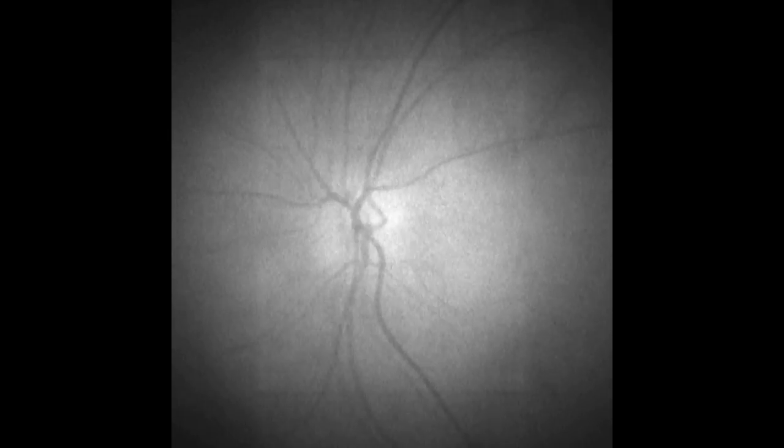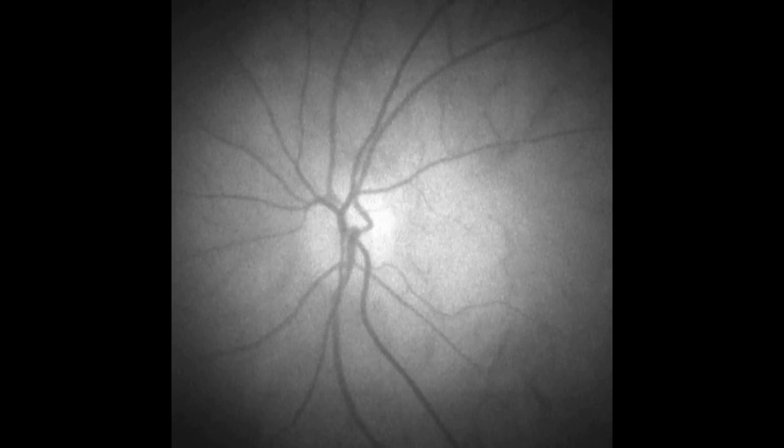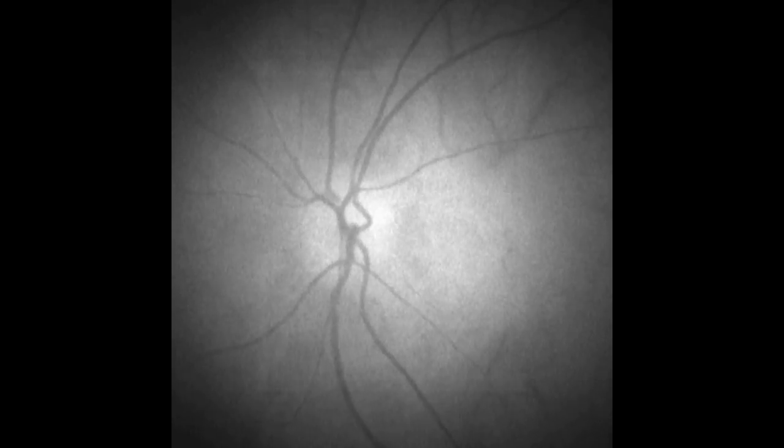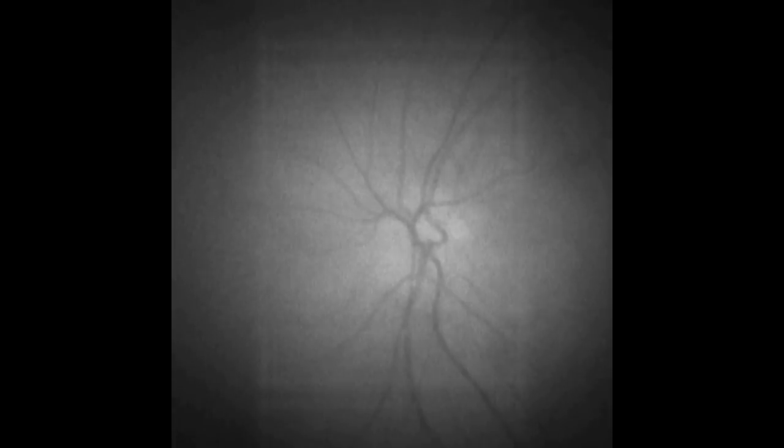The major limitation of this technique is the requirement of an ultra-high-speed camera to record optical fluctuations with a sufficient bandwidth. But that can be circumvented by leveraging slower streaming cameras that can be used for real-time holographic imaging with the Holovibes software, which can handle robust image rendering and processing.